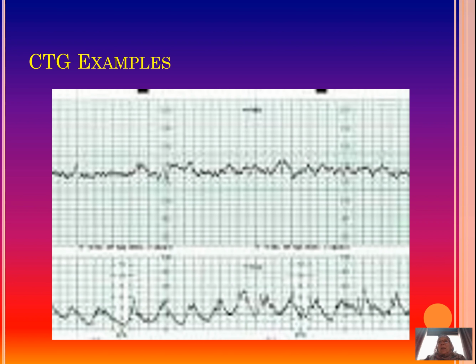So you will have to examine the patient, put your hand on her abdomen and feel the contractions, see if they are painful or not, and what effect they have on the cervix. Does the cervix dilate or does it not? Then if you go up, you see the baseline around 140, a normal baseline, normal variability, but you cannot really see clear accelerations or decelerations on the CTG.